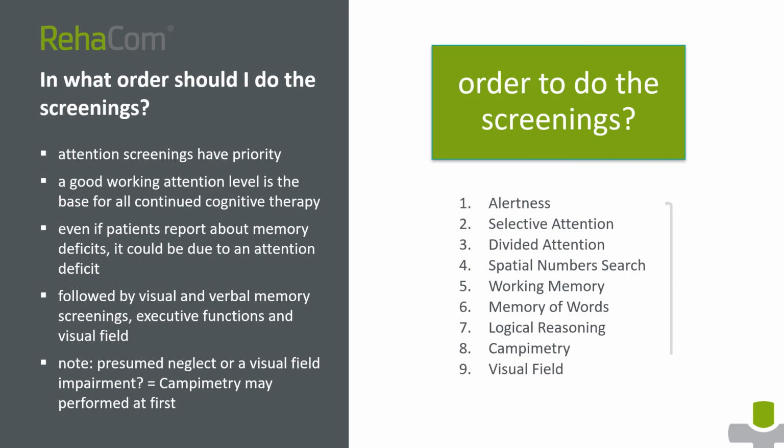However, there's a special circumstance to consider. By that I mean a presumed visual spatial neglect or a visual field impairment. In this case, you may verify your guess by using the visual field screening campimetry at first.